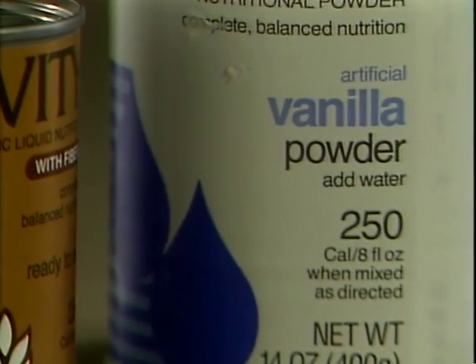Others require mixing. Because the formula is an excellent media for the growth of germs, one of the biggest concerns with enteral nutrition is microbial contamination of the formula and equipment. All commercial enteral products are prepared under sterile conditions. Here are some safety guidelines to follow to prevent contamination.